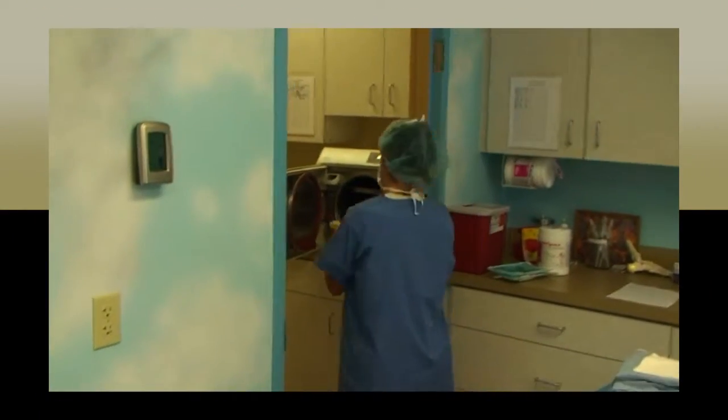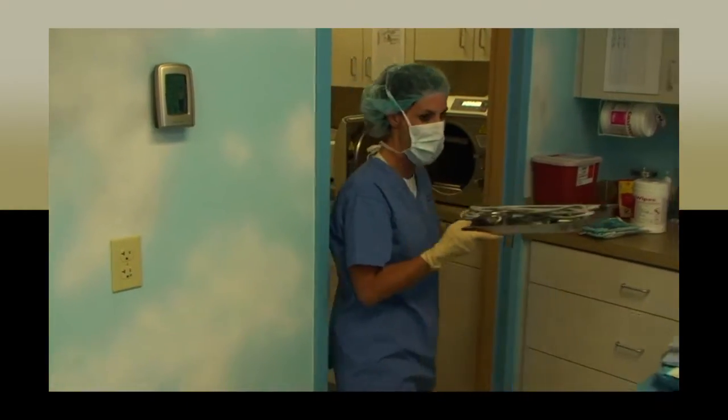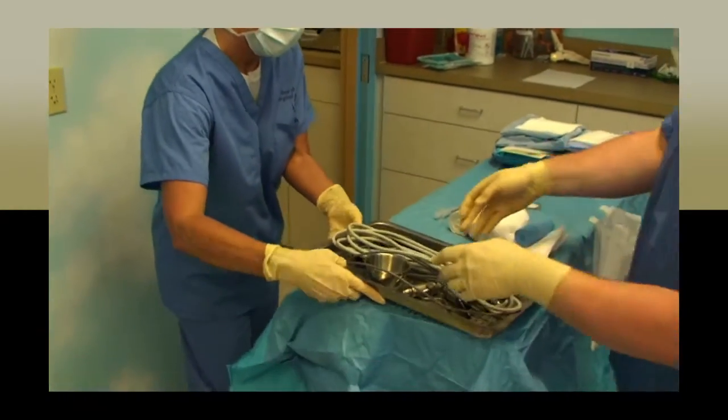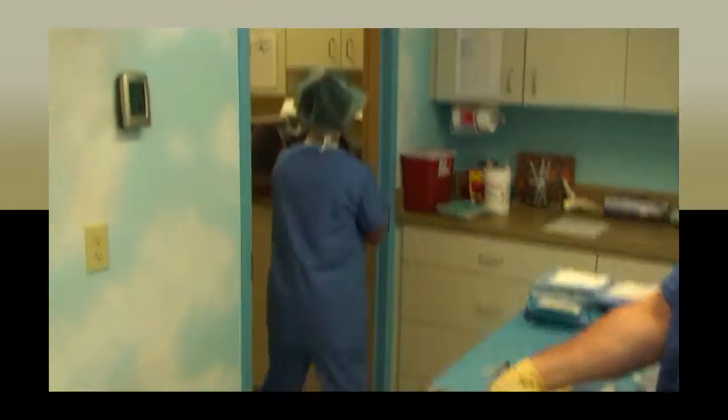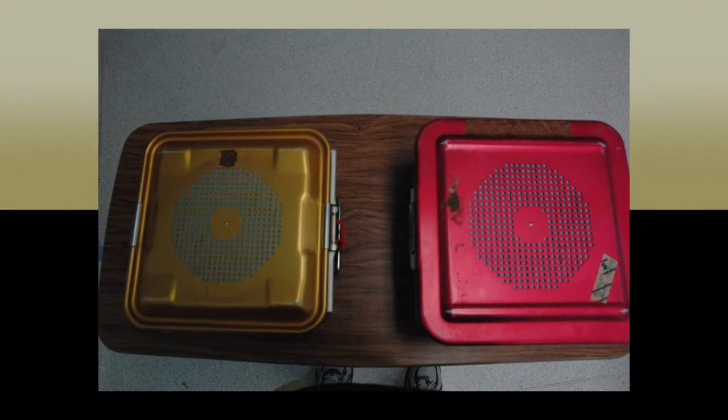When the field has been set up and the required materials have been placed on the field, you will then need to retrieve the instrument kits from the autoclave or storage area in the closet of the OR. There are 2 types of cases of instruments. One case has a yellow top, the other a red top. The yellow-topped instrument cases are the subpar instruments. They are older and do not work as well. They may be used in cases of emergency but should not be used unless necessary. The red-topped cases are the newer, more effective tools that the surgeon and scrub assistants prefer.